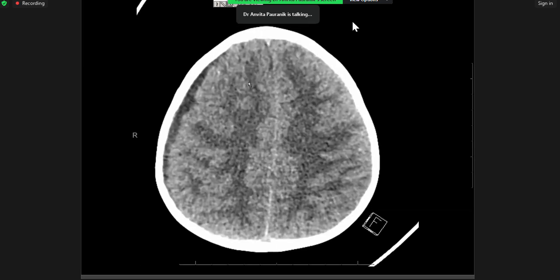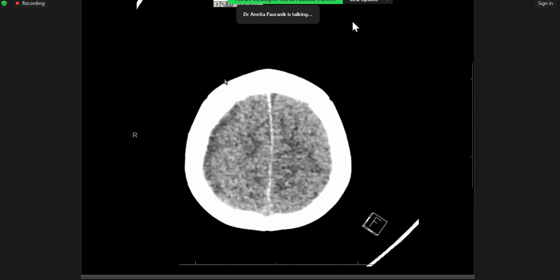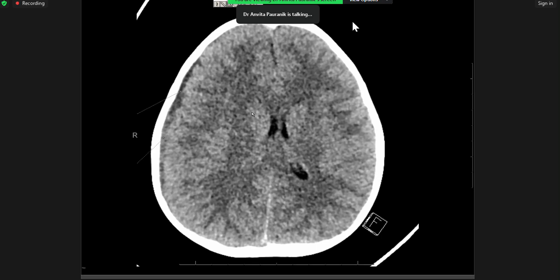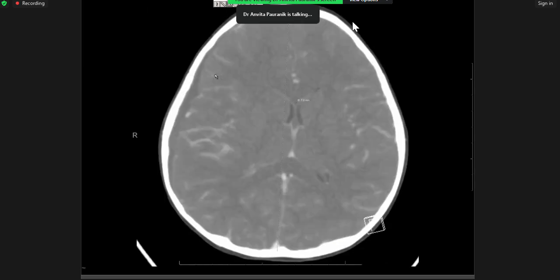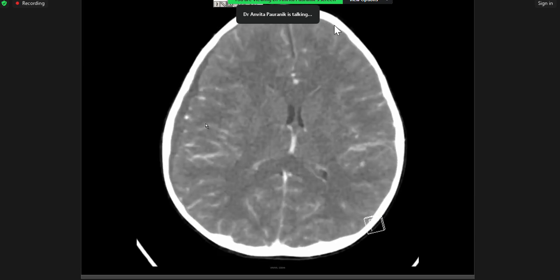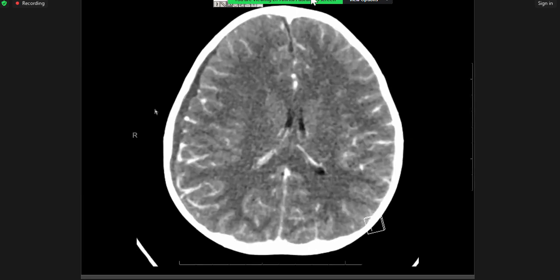And if a child has a clear clinical presentation of infection, fever, headache, lethargy, and you see such a big collection, definitely the next step is to do a contrast enhanced venogram or a contrast study to look for any filling defects in the venous sinuses. And that was done. So let's see. You can see the collection. Is it enhancing or not? Non-enhancing, ma'am.